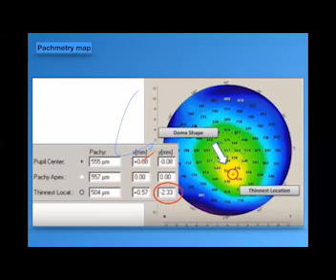But the inferior steepening in one eye could raise suspicion of early conus in that eye, because of the correlation between both eyes together. If we check this eye separately, we will consider it a normal eye.